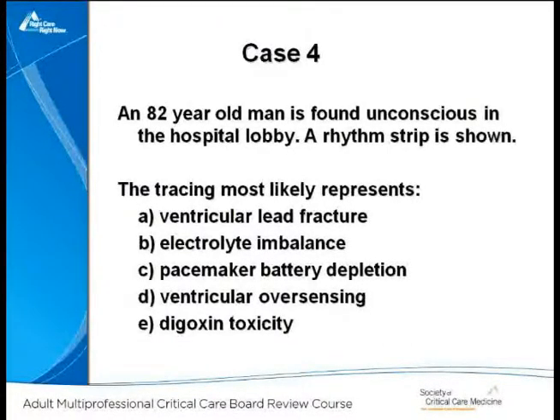So okay, an 82-year-old man is found unconscious in the hospital lobby. A rhythm strip is shown.